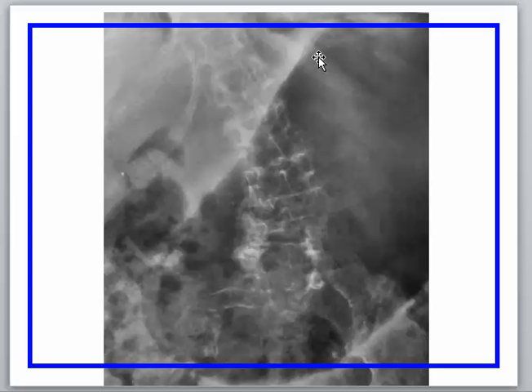This is an appearance of a markedly dilated stomach filled with air, outlined with air, and this is the duodenal cap. So the duodenal cap, canal, pylorus, and body.